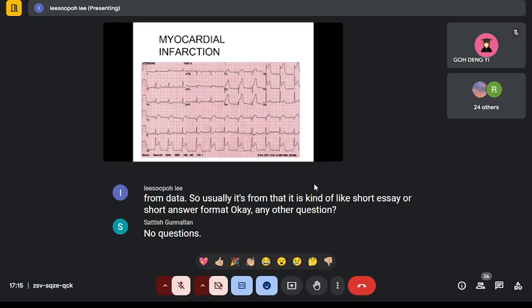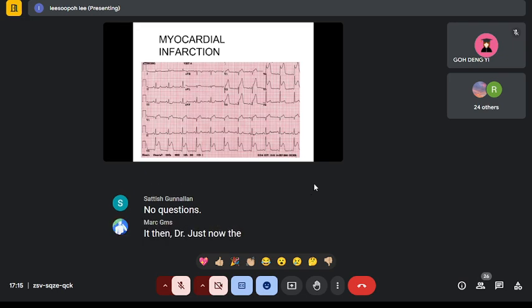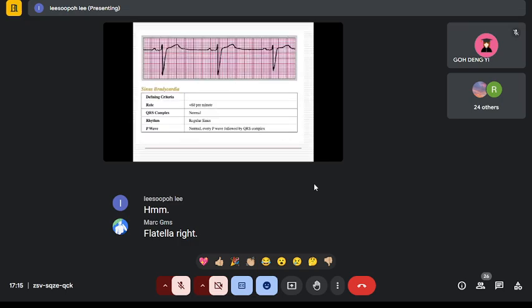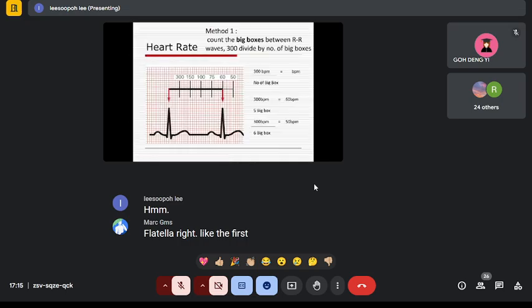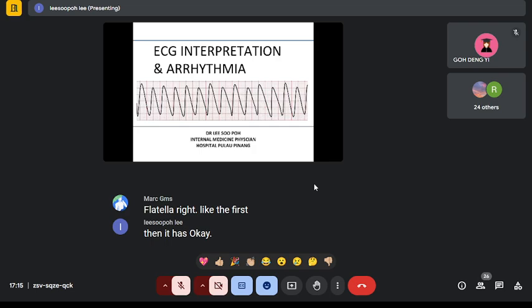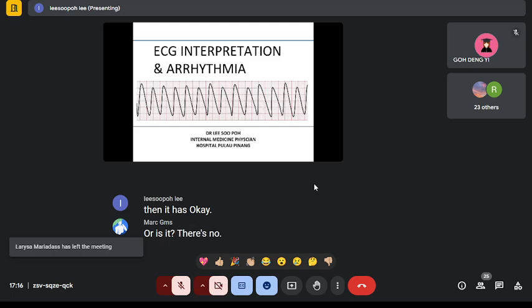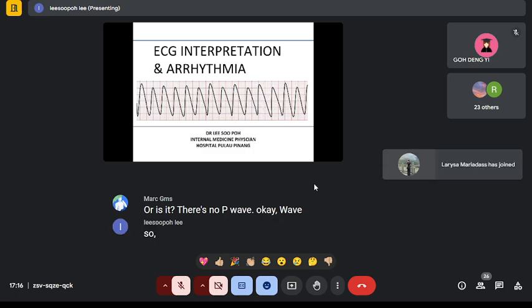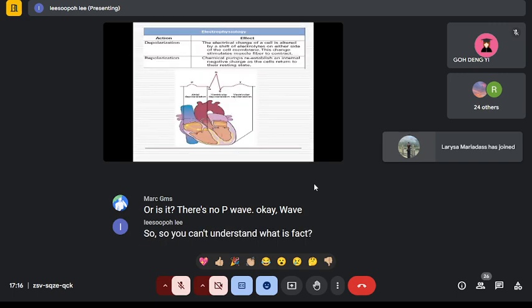No question. Then, doctor, just now in the beginning, the answer is flutter, right? Give another chance. Okay. Or is it? There's no P wave. No P wave. So you can understand what is flutter.